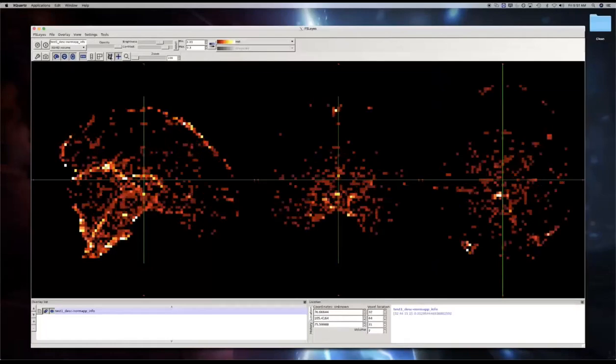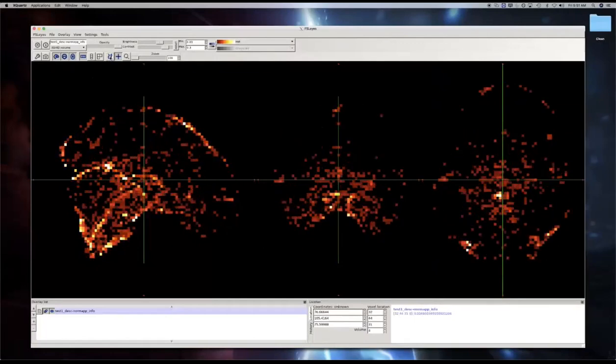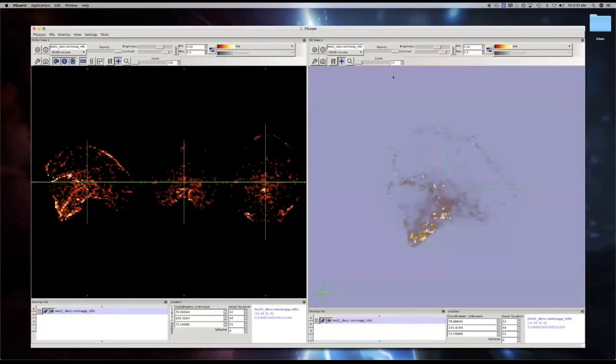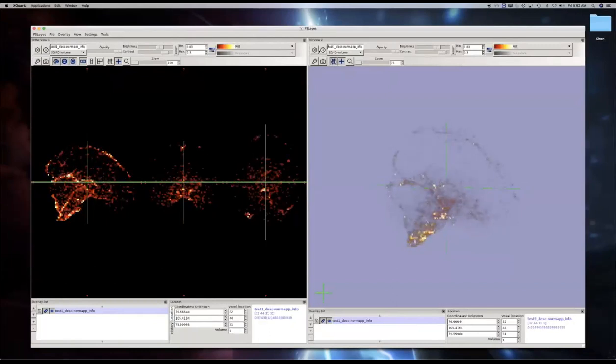And you can follow the signal here throughout the brain in 2D or Control 6 in 3D. And you see this beautiful video where you can slightly make out the vessels. You can also interpolate into different things so it's more clear, or we can directly go to the vessel map.